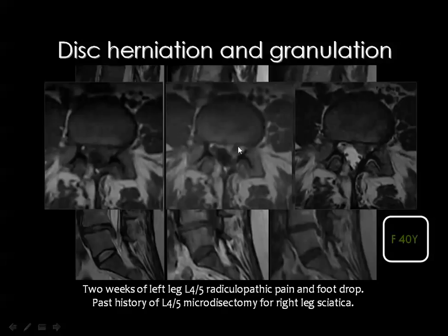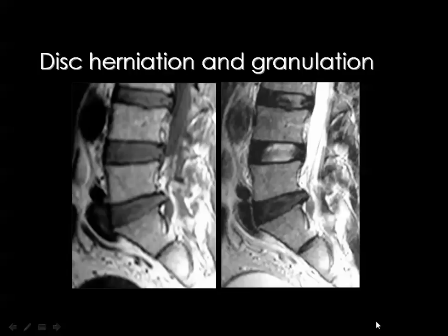In the T1 post contrast, you can see enhancement representing the granulation tissue and the disc substance inside this granulation tissue. And also here, it is easy in the T2 weighted image to separate between the herniating disc and the associated granulation tissue.